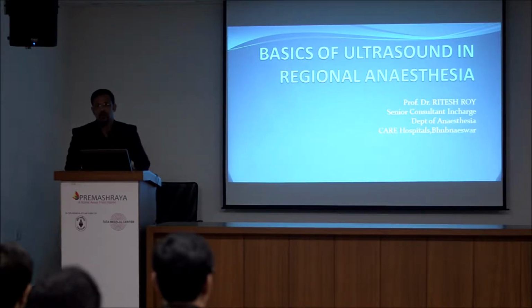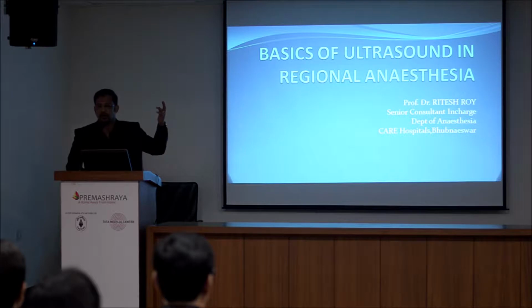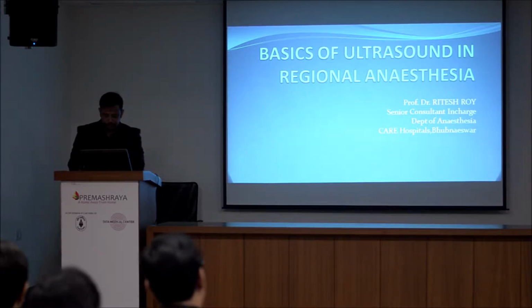In basic ultrasound, there are many things which you will learn about the machine in the station. Just a brief overview.